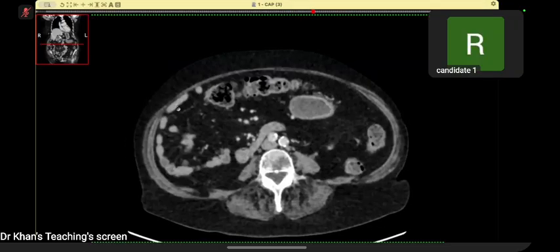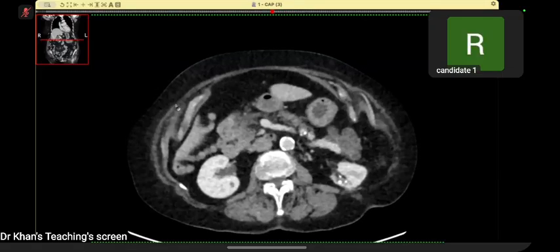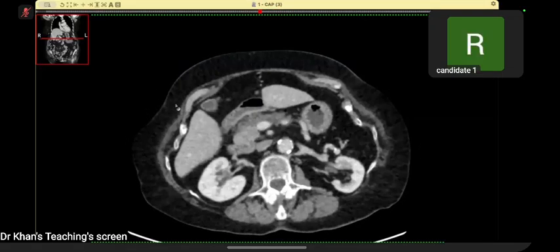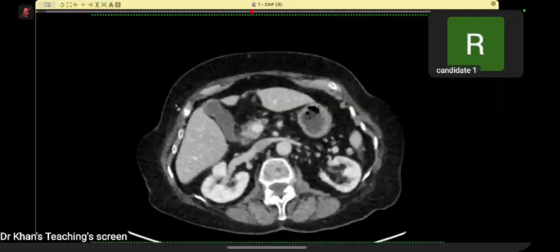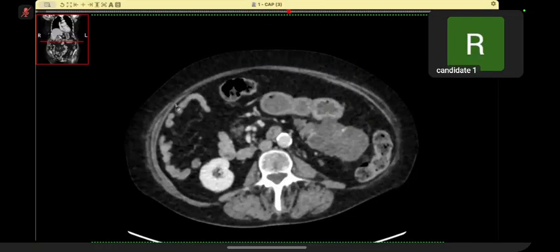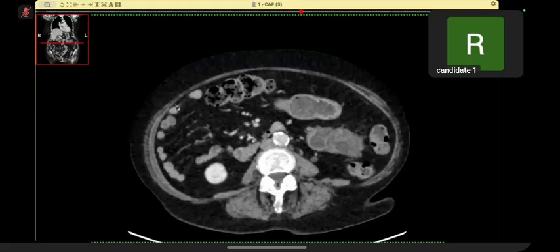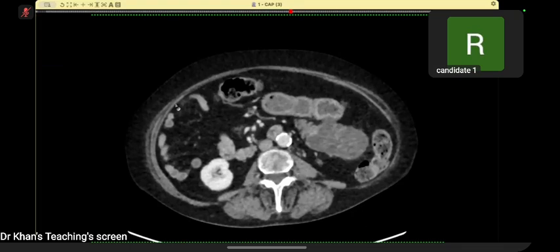Can you show me the pancreas body again, sir? I do not see any vascular thrombosis. Vessels are patent. Head and neck are unremarkable. The distal body and tail are expanded with heterogeneous enhancement and multiple small cystic foci.